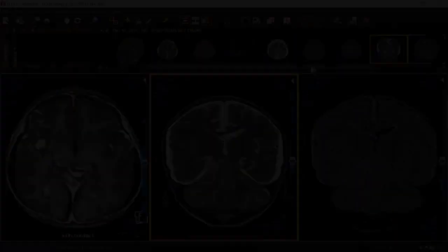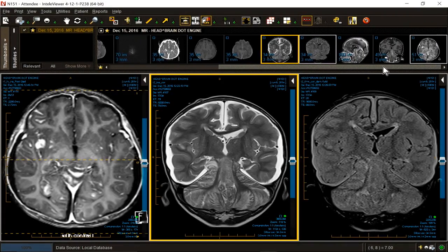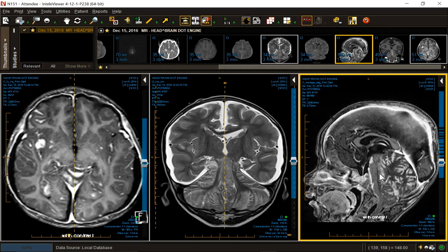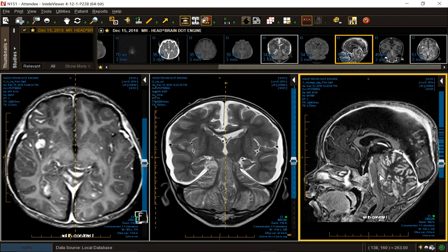So that takes us completely out of something like, say, the pilocytic astrocytoma and many other astrocytic neoplasms. So now we have a mass that exhibits the Zuckerguss, or sugar icing sign of enhancement. There it is. Looks like you put a little icing on your ice cream cone. A plane of separation from the brainstem, dissemination, solidity, low cytoplasmic to nuclear ratio. Person is under age 5.